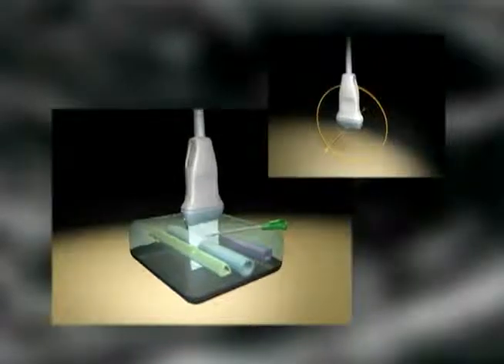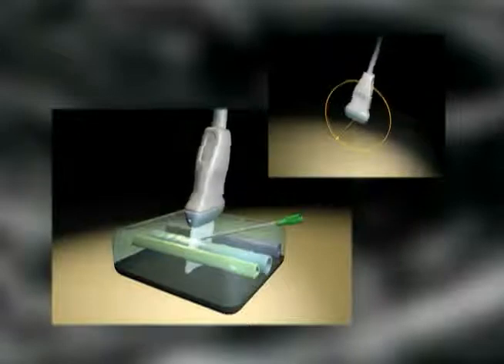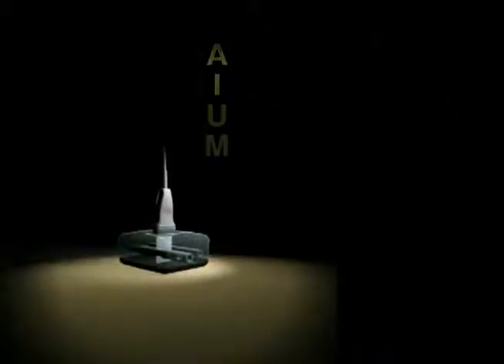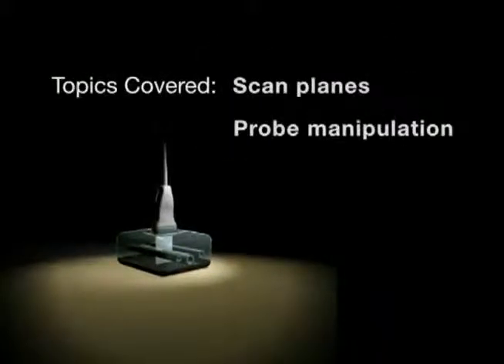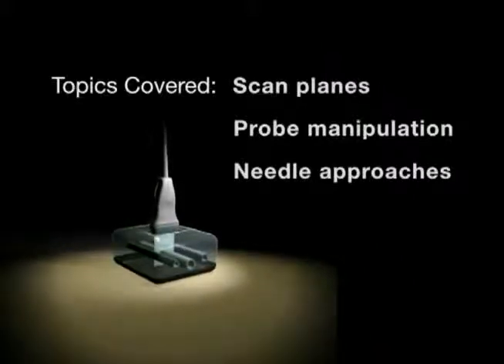technique, it is useful to describe basic nomenclature for needle and probe manipulation. Much of this is derived from the American Institute of Ultrasound in Medicine standards. We will describe the two basic scan planes, the 5 probe manipulation maneuvers, and the 2 needle approaches.